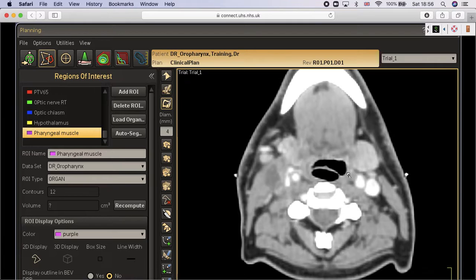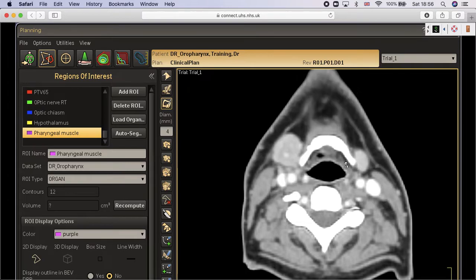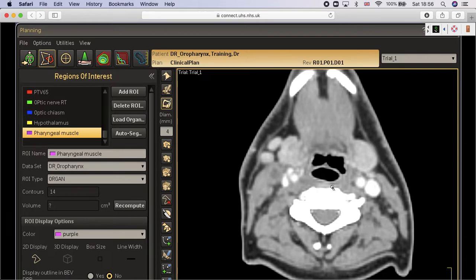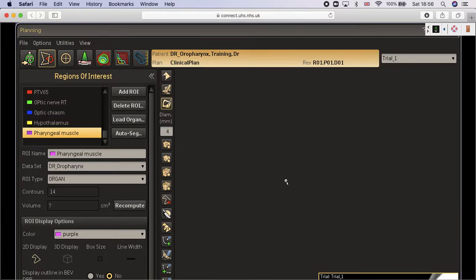Okay, and then the hyoid bone will come. You can see the hyoid bone here, and usually with the upper border of the hyoid bone, you end up your pharyngeal muscle. There's no more superior pharyngeal muscle, sorry. And then we'll start the middle pharyngeal muscle. The middle pharyngeal muscle is a very small piece of tissue between, let's see if we are at the level of C2, cervical spine 2, by the way. Let's go to the sagittal view. Let's see if we are correct or we are doing something wrong.